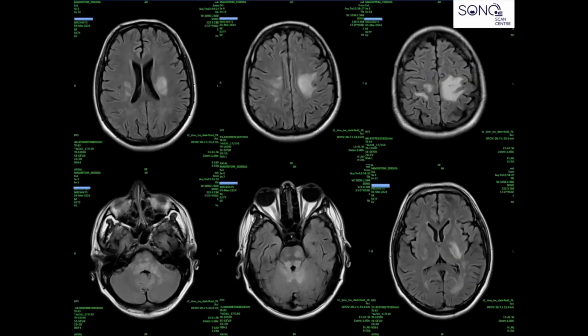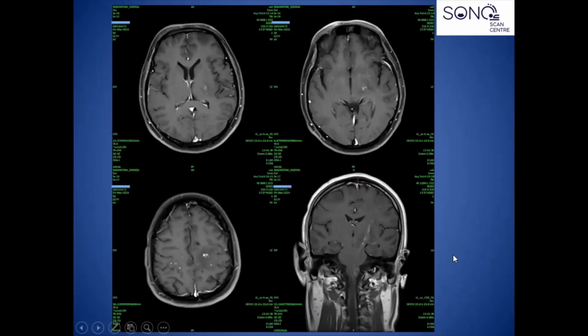So the same case, it has multiple lesions here, right? This is a FLAIR axial sequence. It is noted in the deep white matter with the edema. Even the brainstem is involved here. Look at how the lesions are there in the brainstem, seen in the periphery, right? They are asymmetrical actually. On the left side, we see the middle cerebellar peduncle and the infratentorial, but on the right side, we don't see here. Look at the basal ganglia involvement is seen.